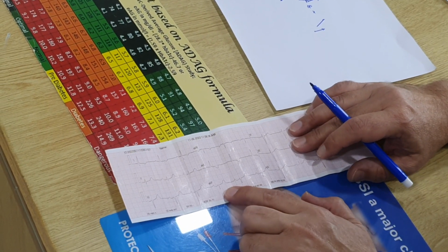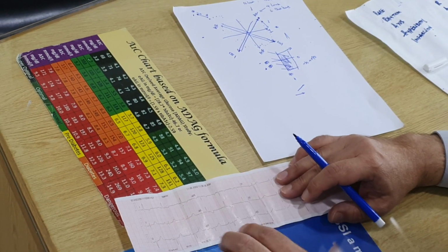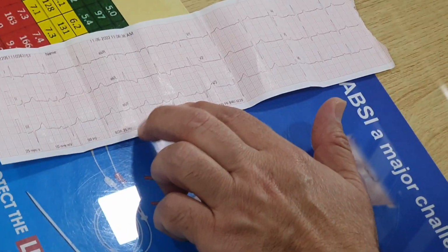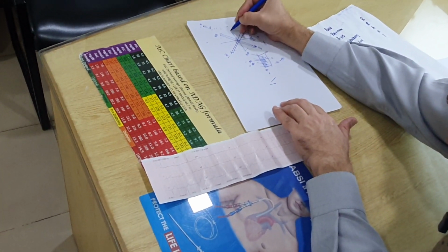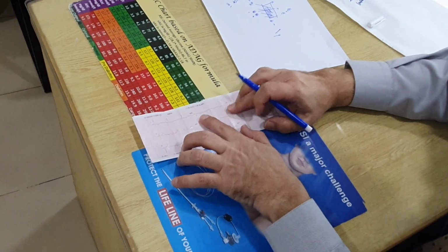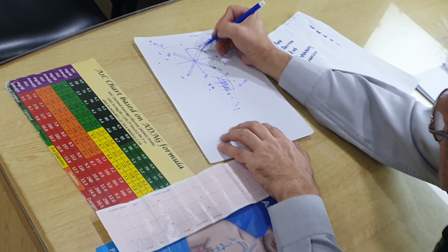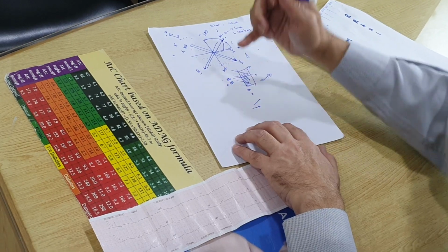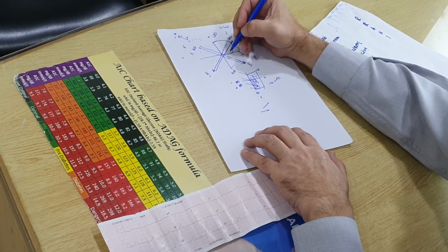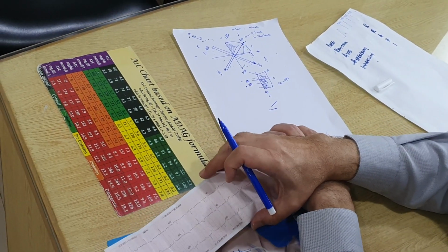And this can be confirmed by looking at AVF. So far we didn't really worry about the AVF, but this is where AVF, AVR and AVL come in. You look at AVL, AVL is mainly positive, so the vector is towards AVL. You look at AVF, it is all negative, so the vector is up towards the negative side. That means the vector is around here somewhere. And then you look at AVR, and the AVR is negative as well. So that means the vector is not here. So the vector is around here, and looking at AVF, this becomes left axis deviation because you've got a totally negative wave pattern in AVF. So this is left axis deviation on this particular ECG.